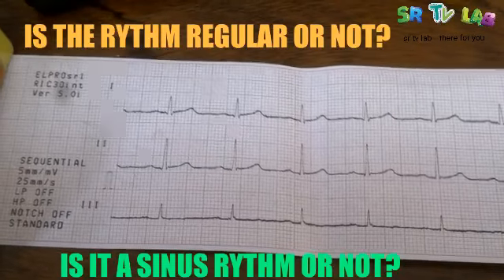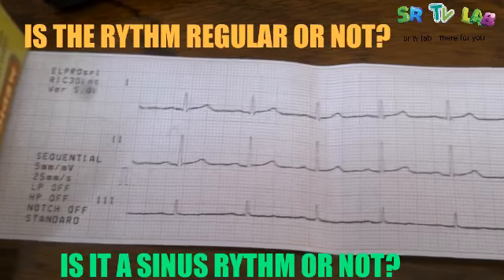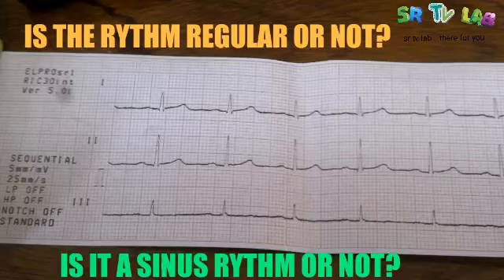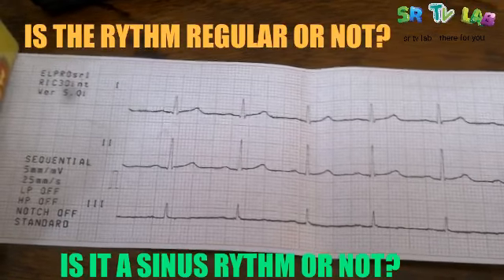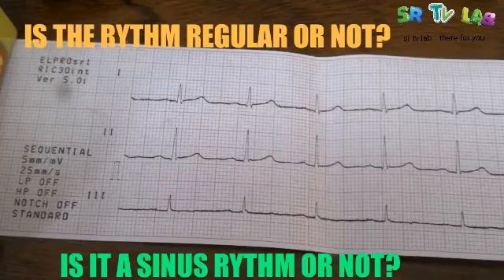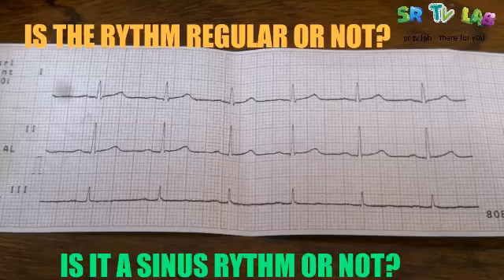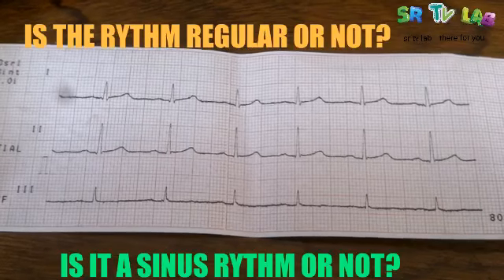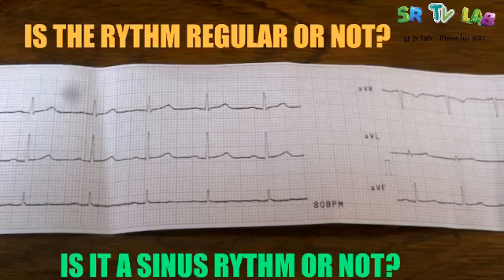In order to know if the rhythm is sinus or from the SA node, you look for a P wave in one or more of the limb leads. Do you get me? To see a P wave in any of the limb leads. And you remember the limb leads.